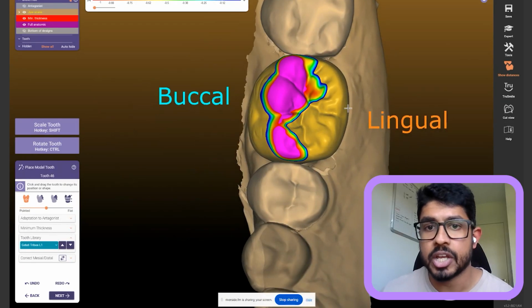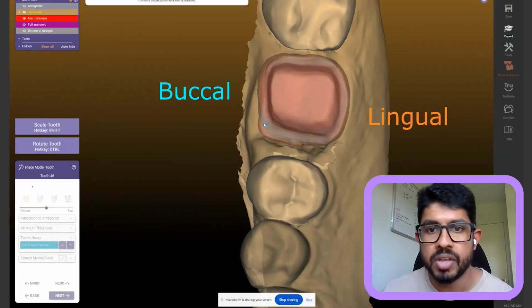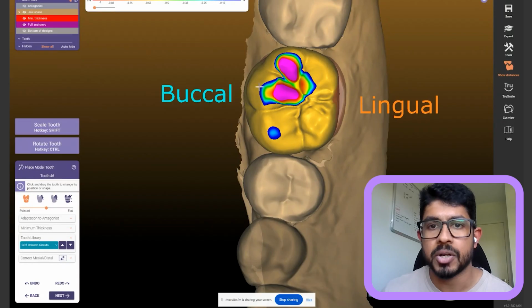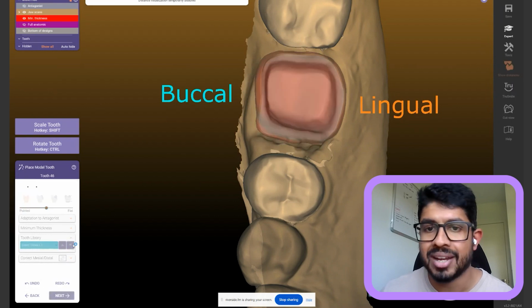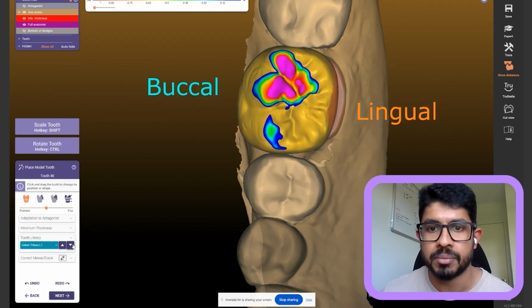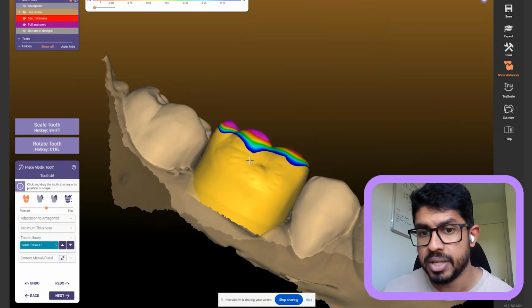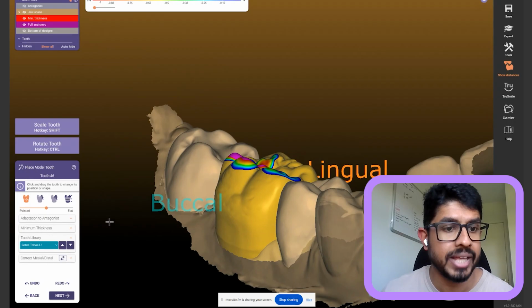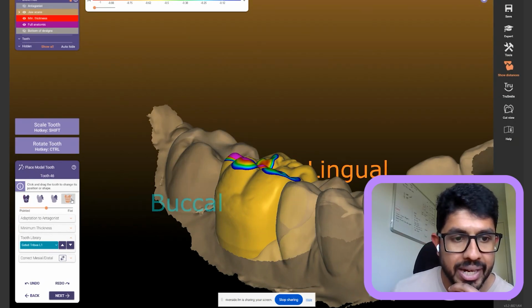For single crowns, I go based on the space that I have over here. If I look at the previous one, it looks too bulky in the buccal, and it has point contacts over here, which I'd be sitting and contouring and adjusting. I just switched between libraries because for single crowns I can find something better. This one has a wide proximal contact, so that works for me. So I'm just going to stick with this one and move forward.